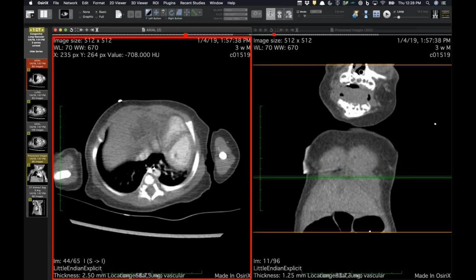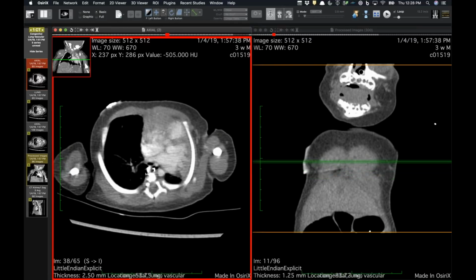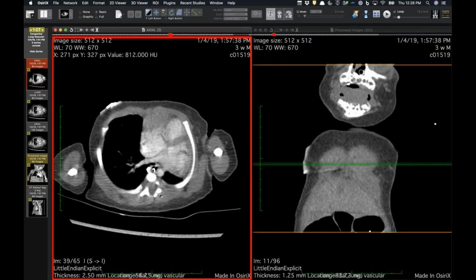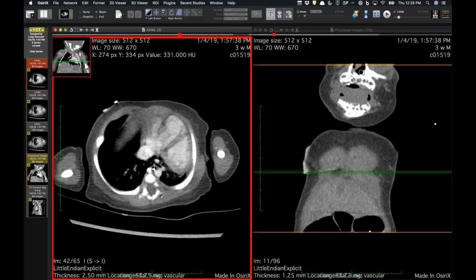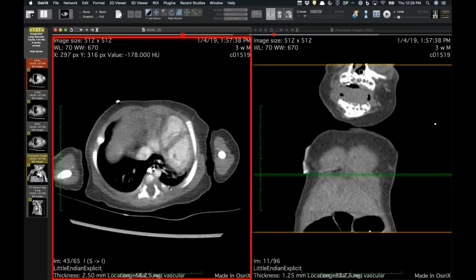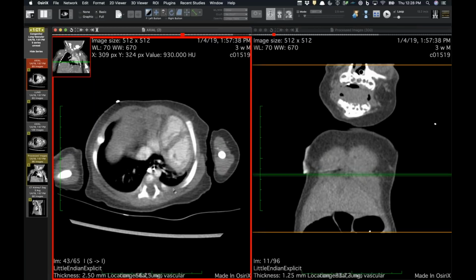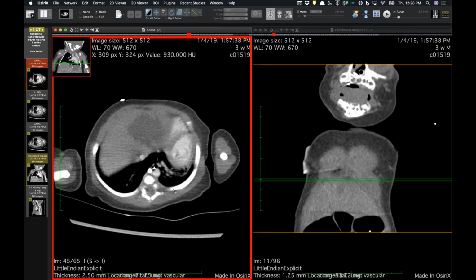You brought that point up too. There's no anomalous venous drainage of this right lung, and the other clue is there's no left-sided pulmonary veins either. This is just complete agenesis of the left lung. And the distinction between aplasia and agenesis is really academic.